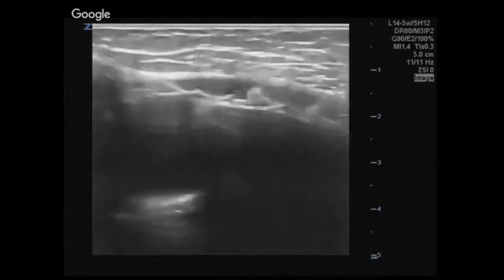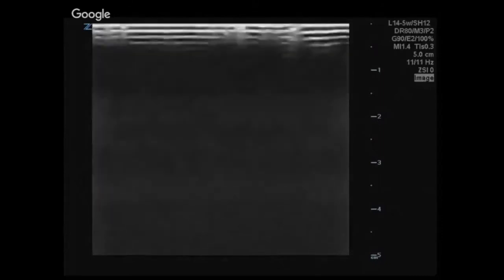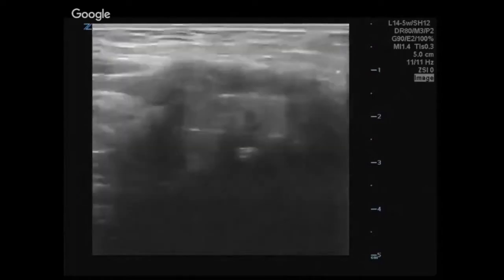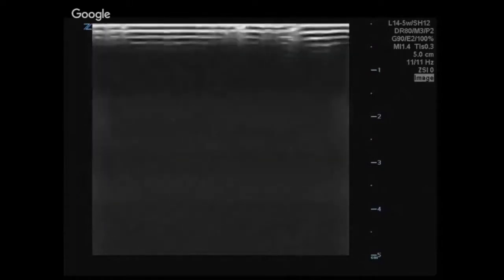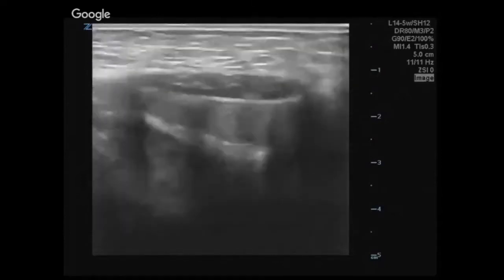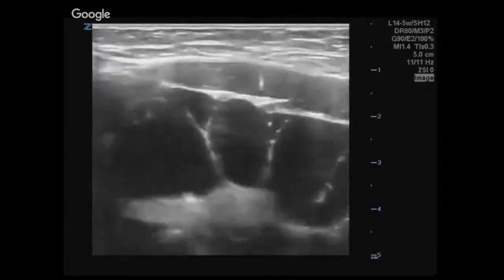So yeah, interesting. It looks exactly the same as the neck lymphatic malformation that we had seen at the beginning of the presentation. You can have lymphatic malformation from anywhere, really. And that one was in the bowel and in the mesentery.